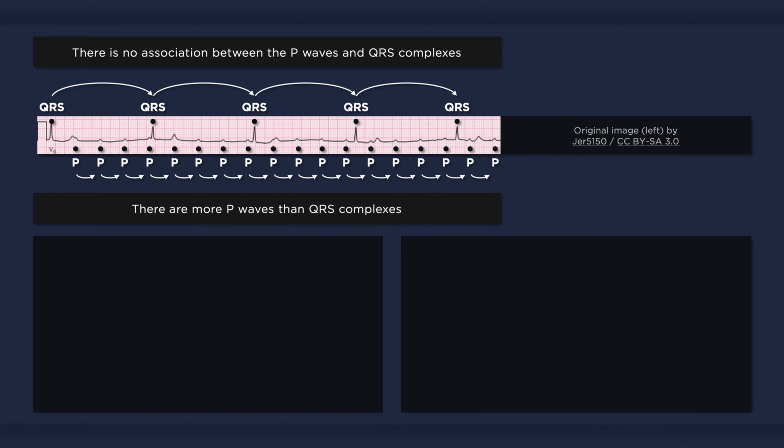So essentially, the ECG has two regular rhythms. The P waves are just marching along minding their own business, and the QRS complexes pop up when they can no longer wait for an electrical impulse to come through. There is no PR interval, just a random space between asynchronous P waves and QRS complexes. In this rhythm strip, you may have noticed that the QRS complex is rather narrow.